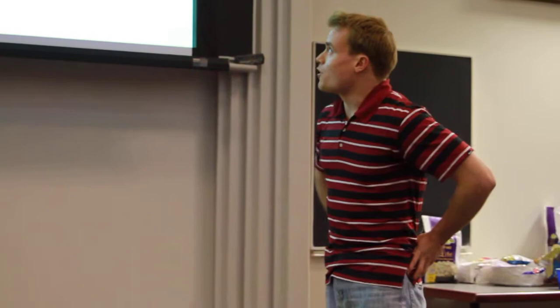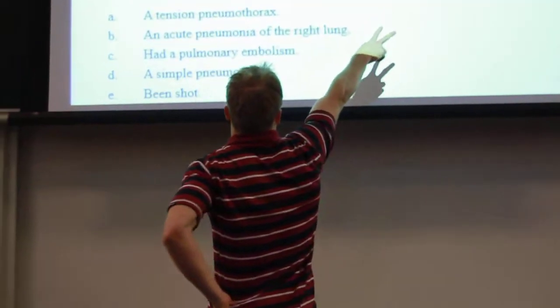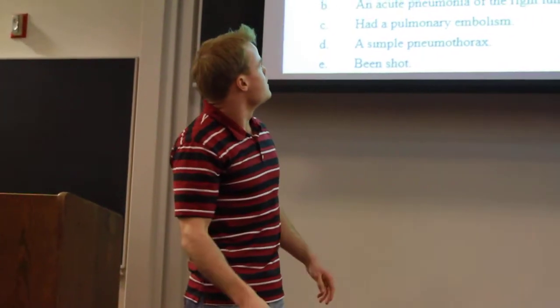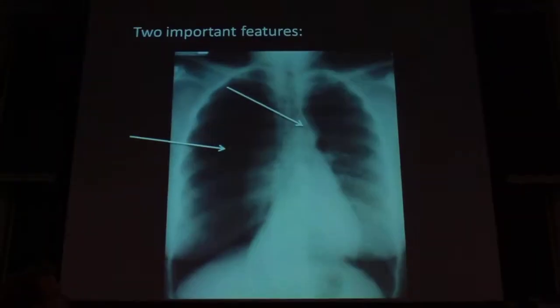So if we compare to the normal, I want you guys to think about what's different between this image on the left side and this image on the right side. And these are the possible answers which you're going to be looking at.